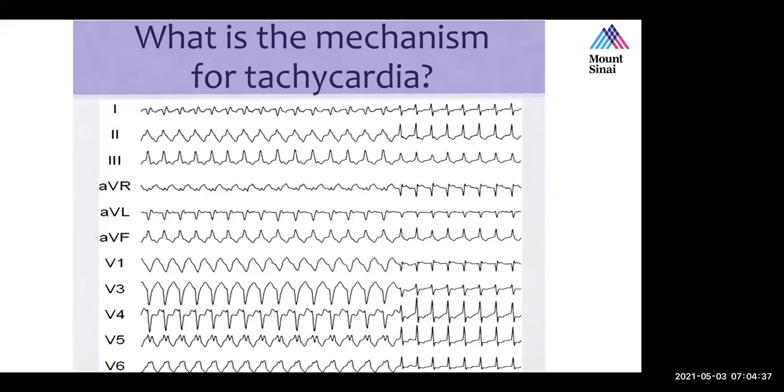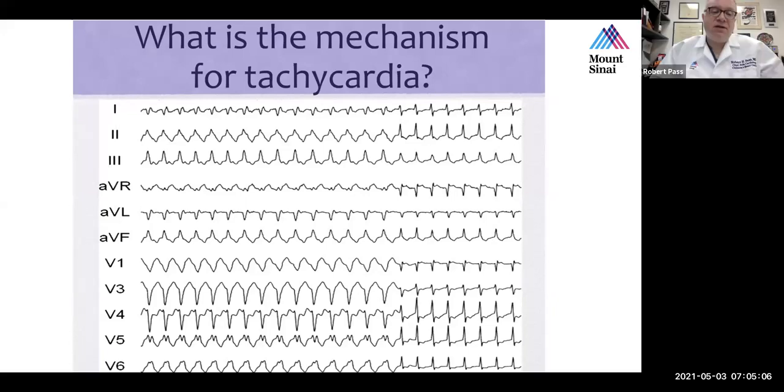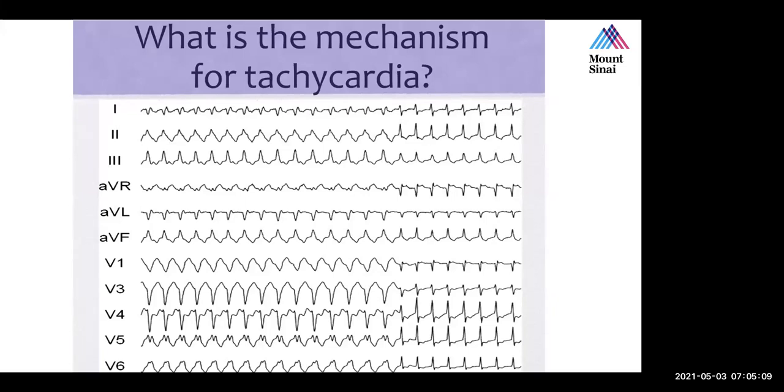And then because we have been lucky to capture the warming up period, I know there's a way, based on the bundle branch morphology, we can tell which sided pathway it can be. And it looks like right bundle. Does that look like the right bundle? No, sorry, let me see. It's a left bundle branch block. So it's the opposite, right? It's a right-sided pathway.